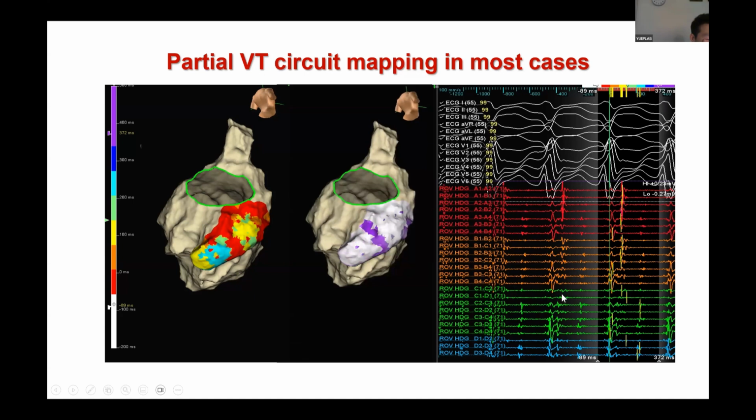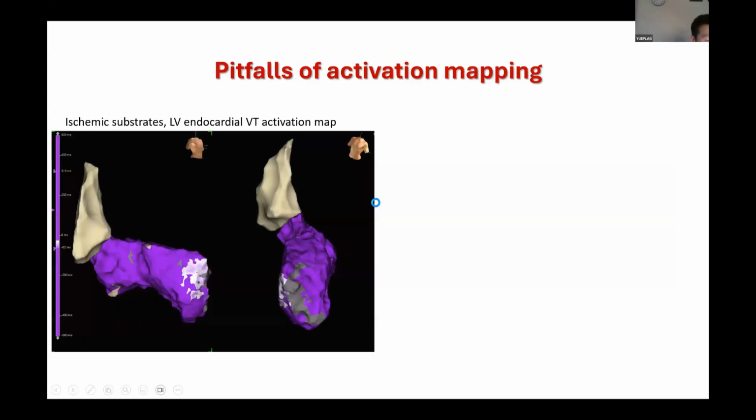But if you could only localize one electrogram, sometimes it could be only one very sharp potential, could be the double near field, could be the triple near field, but you could only annotate it once, so it will confuse you as the guidance.